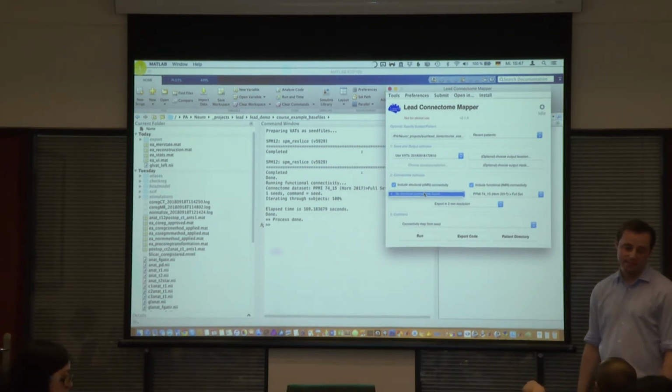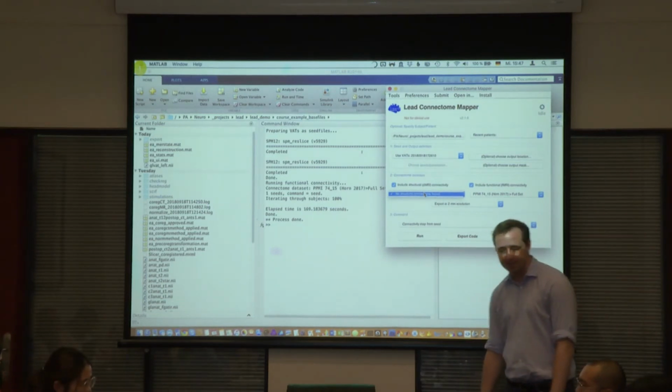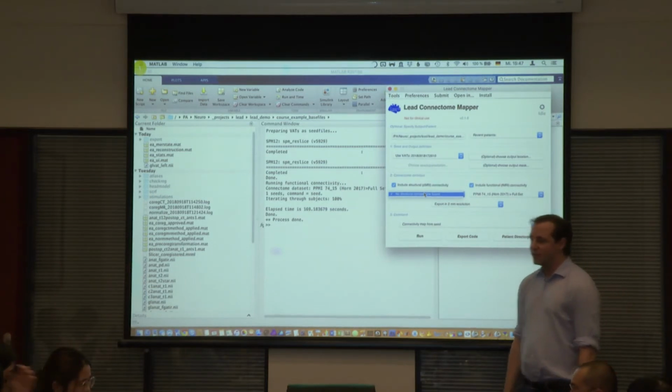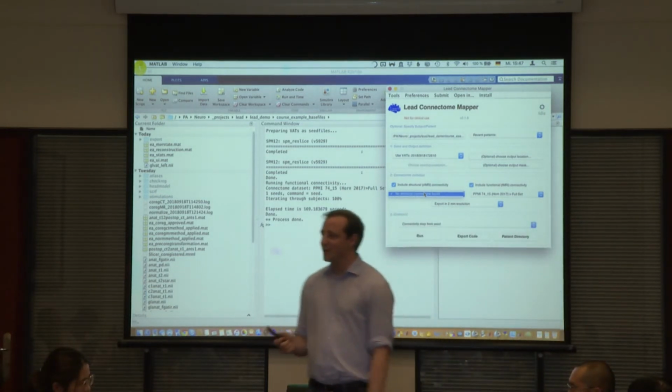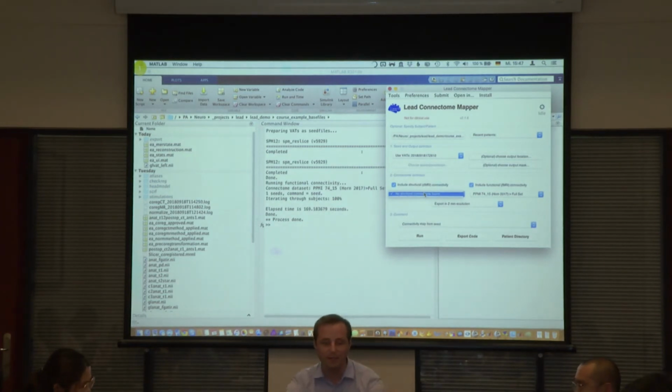It's in MNI space, right? So yes, this will all always be in MNI space. Okay, and I think you were asking about how to then create these R maps, right? That there is code for that.